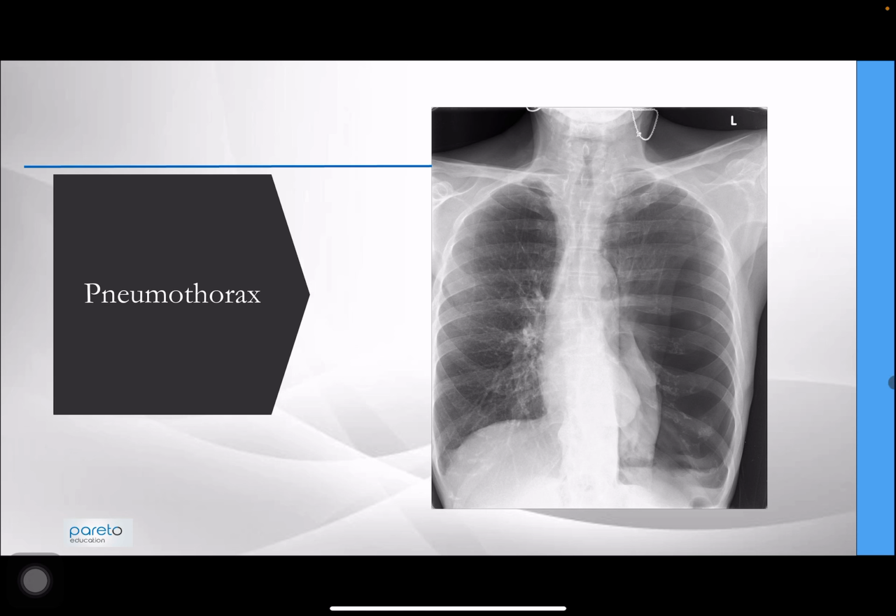And that's it. Those are some common x-rays that you need to know. I hope that's been useful for you. And you need to look at as many as you can in order to really master x-rays.